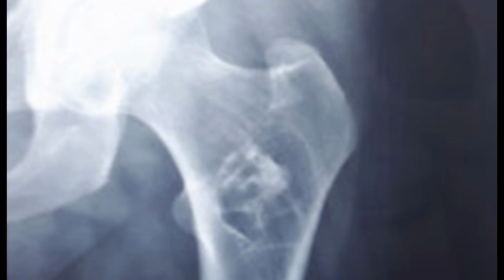It is mostly a lytic lesion with sclerotic surrounding margins, slightly irregular, and in the center you can still appreciate some soft tissue with thick septations. However, thick septations apply to the liposarcomatous form, but I will explain it in the subsequent images. This is a classical example of the lipoma, and it will appear lytic, surrounded by sclerotic margins.